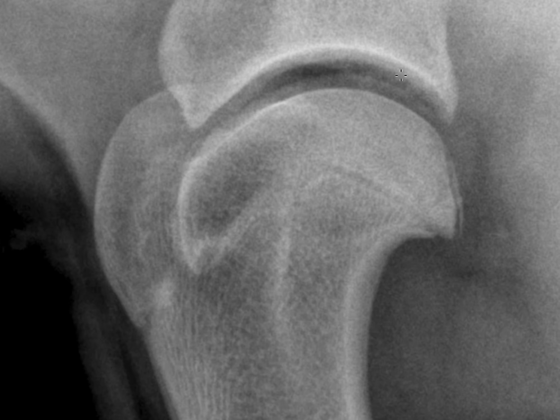This is not something that we've put there. What happens here is, to position the limb, we are pulling on it, and that will cause the development of some gas inside the joint space. It doesn't have any specific clinical meaning. However, we do see this more often in cases where there is osteochondral disease compared to healthy animals.